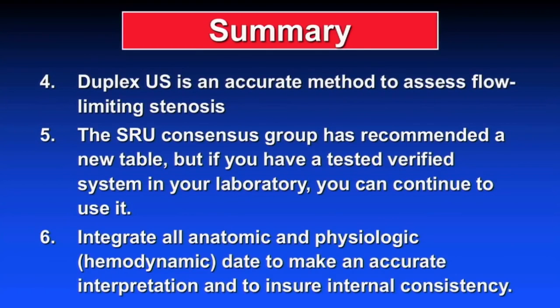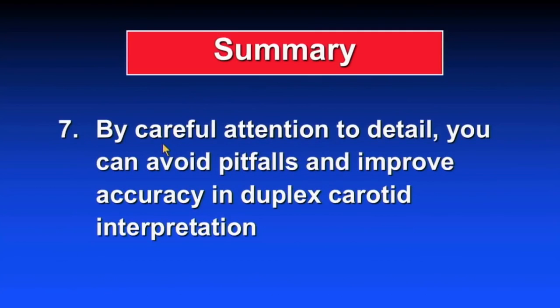And remember to integrate all anatomic and physiologic data to make an accurate diagnosis. And by careful attention to detail, you can avoid the pitfalls and improve the accuracy of your assessment of the duplex carotid vessels.